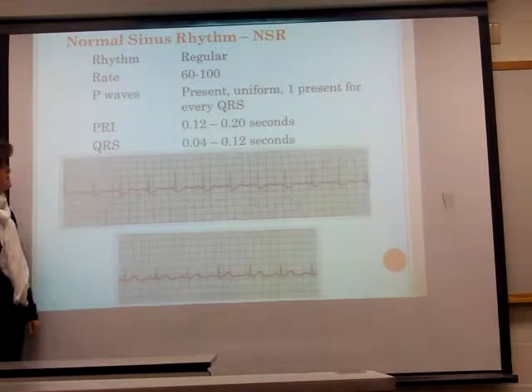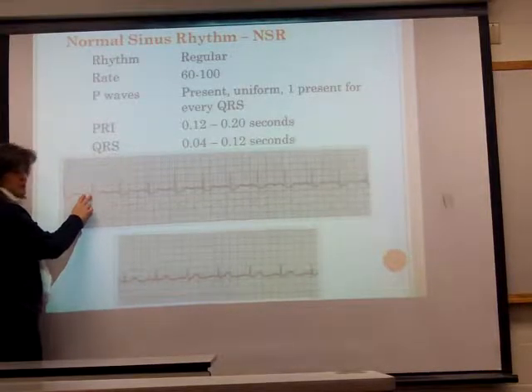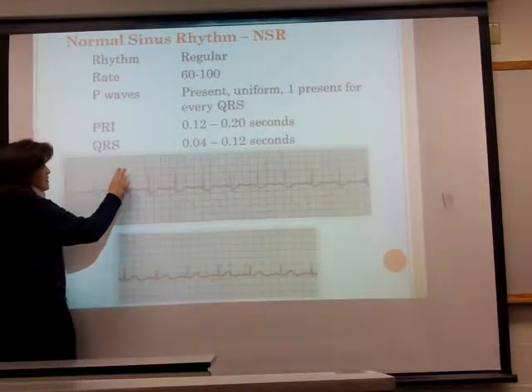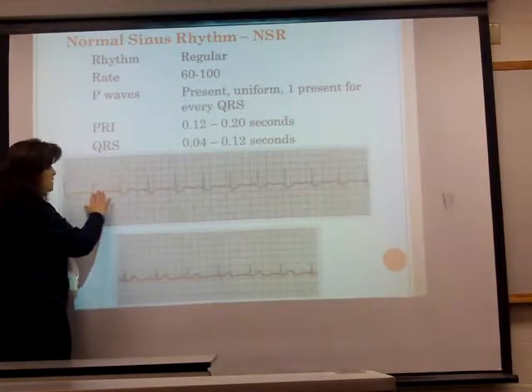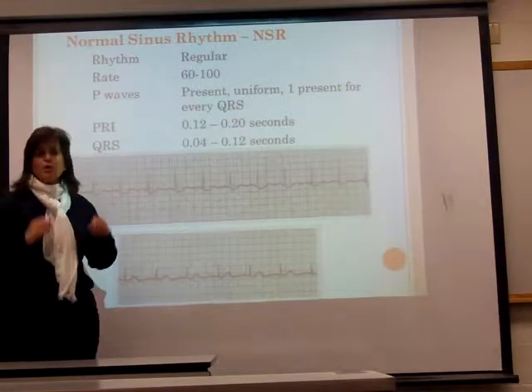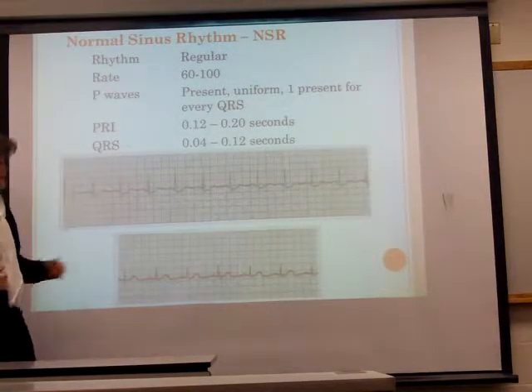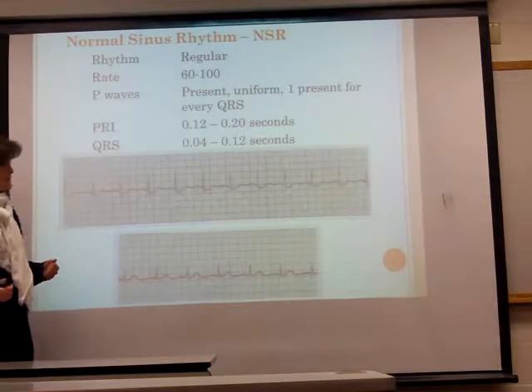The next thing is the PR interval. We're going to measure from where the P wave comes off the isoelectric line to where the QRS comes off the isoelectric line, and that's basically from here to here. Again, when you measure that, pick your calipers up, move them to an area of the paper where there's no complexes because it's easier to count, and you'll notice that the PR interval is somewhere between 4 and 5 small boxes. We all measure things a small bit different. It's okay if someone gets 4 small boxes and you might get 5. So the PR interval here, I would say, is 4 small boxes and 0.16 seconds.